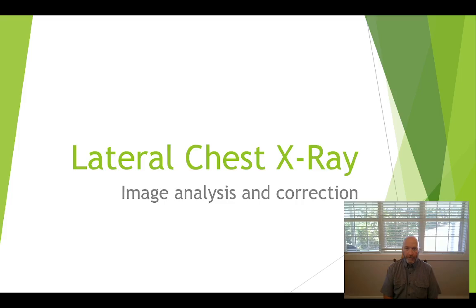If you're a first semester student, then this image analysis and corrections is going to be great information for you, but it's probably going to be advanced for your position in the program and probably beyond what you're going to be tested for in the first semester. But it's great information to know for how to correct your images. Your lateral chest X-ray is going to be the first hard thing that you're going to learn and perform in clinicals, and you're going to have a hard time determining how to reposition.